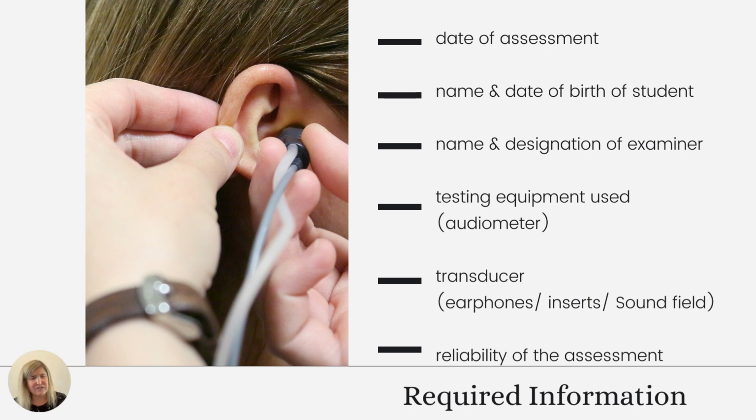It's also important for the examiner to indicate which transducer was used during the testing. Was it an insert earphone, a headphone, or a speaker in the sound-treated booth?